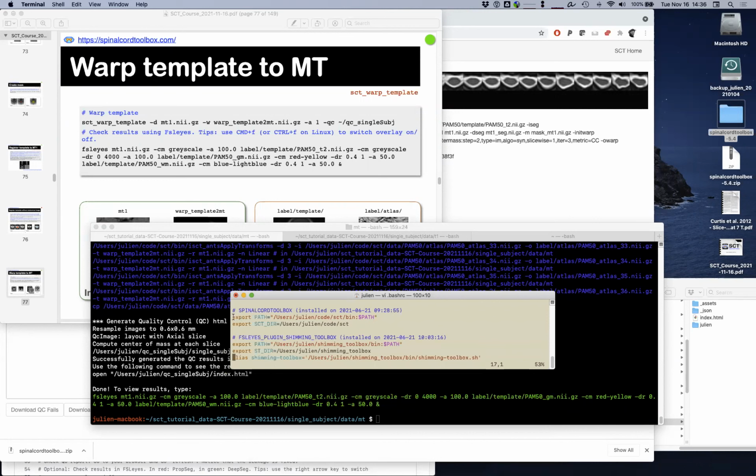Yeah, so you will end up having different lines like this, and you basically want to uncomment the path of the SCT that you want to use. Okay, thank you. Yeah, what I do is in that line, I have the link to the hyperlink. So I never have to update that. I just change the hyperlink in the morning if I want to work on an old project and then change it back. I see. Right.